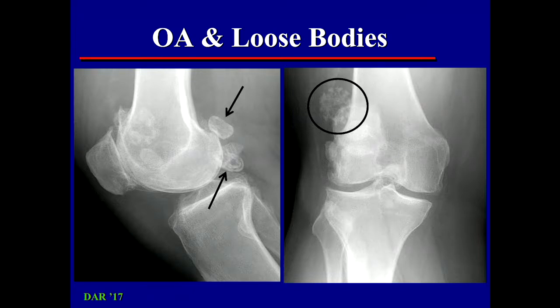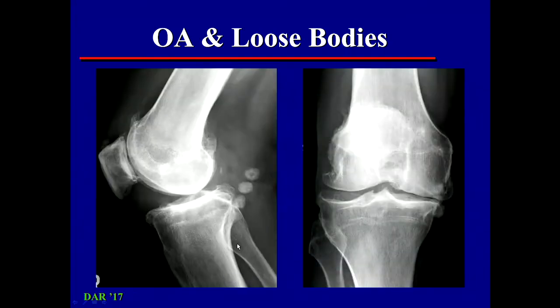So these did come from the articular surface, but when they came from the articular surface, they were microscopic. So you don't want to look at a loose body like this and say, well, I'm looking for the donor site. The donor site is microscopic. You're not going to be able to find it. Now, these are called loose bodies, even though we said they may not be technically loose inside the joint. They may be attached to synovium. They're called loose because they came loose from the articular surface originally.